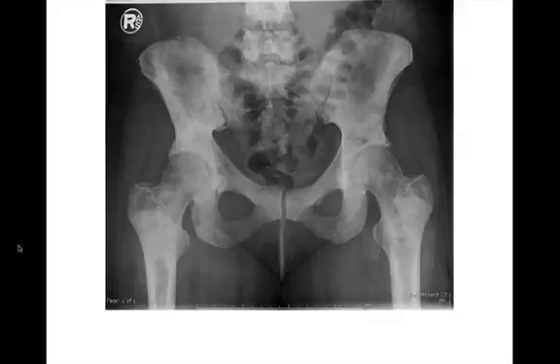Frontal radiograph of the pelvis. There's multiple sclerotic lesions, right, all throughout the proximal femur and pelvis. So just diffuse sclerotic lesions. So what are we going to think of? Diffuse sclerotic lesions, most common, would be diffuse blastic metastasis, and of those, breast and prostate are the most common. So this was diffuse prostate metastasis.